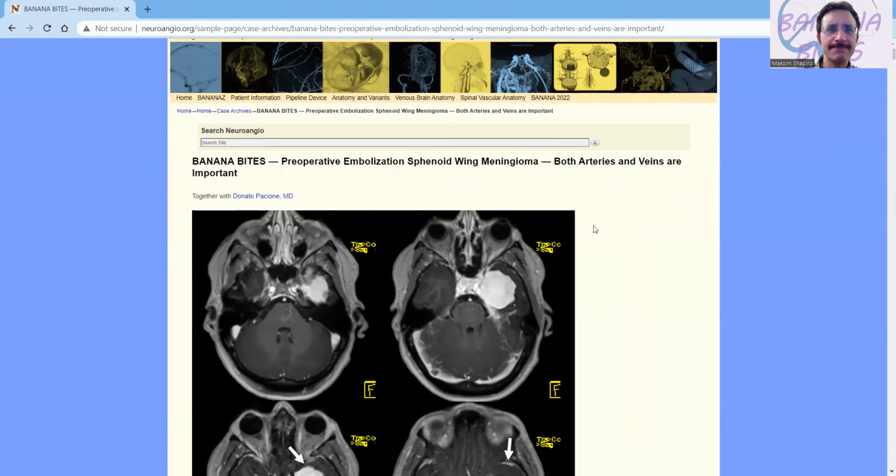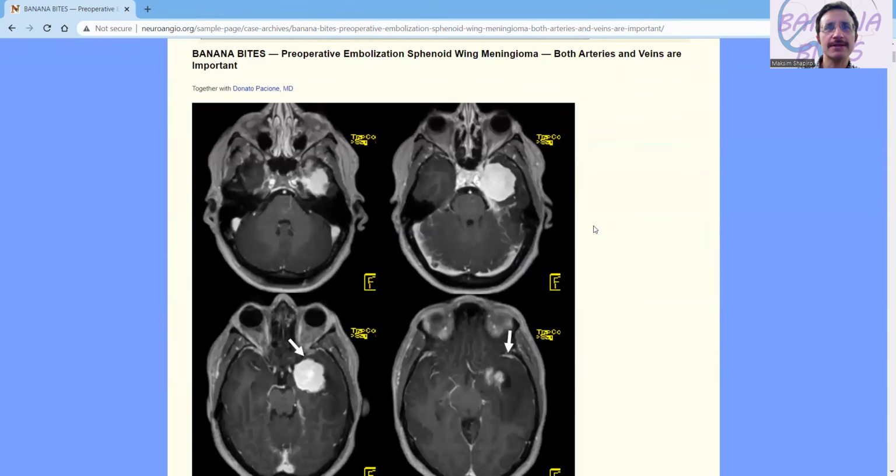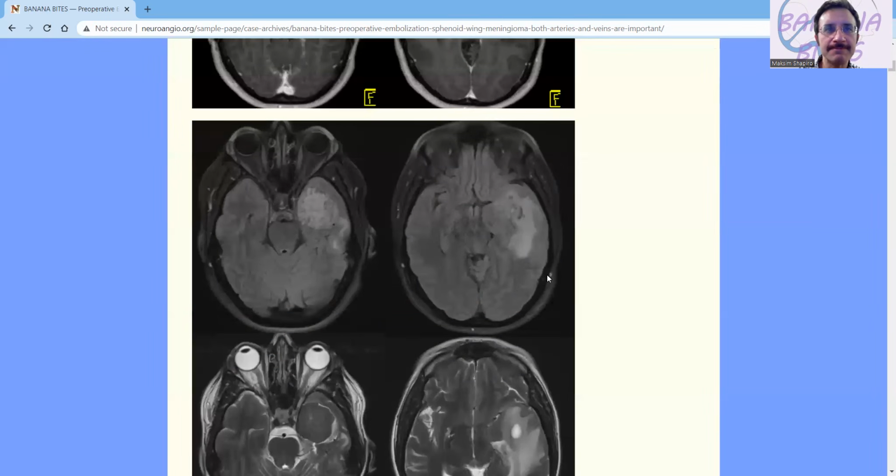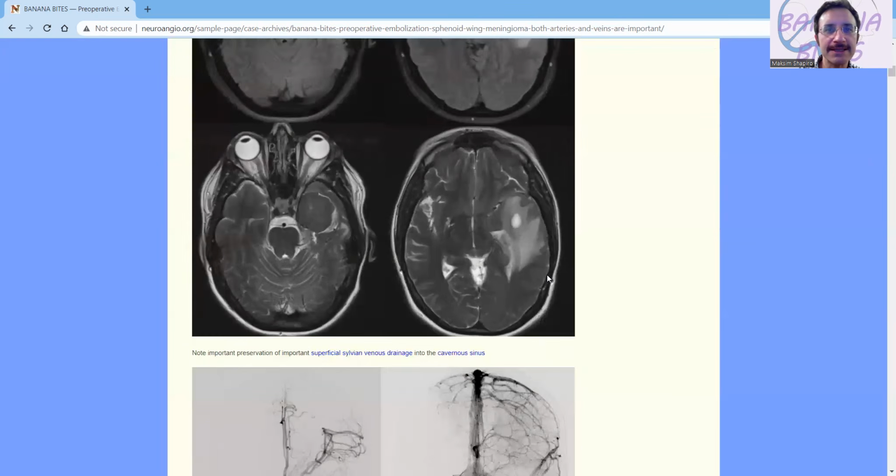Start with an MRI. Now already here on this MR, obviously you can see this big meningioma. Presumably, we do have some important venous points that you could, from the start, appreciate, these sylvian veins that are kind of wrapping around down here. So you can already glean a lot from just looking at this post-contrast MR, and that's going to be important. Now, a lot of edema.